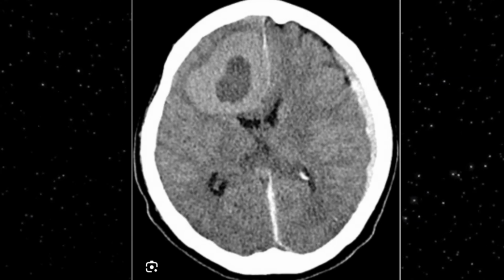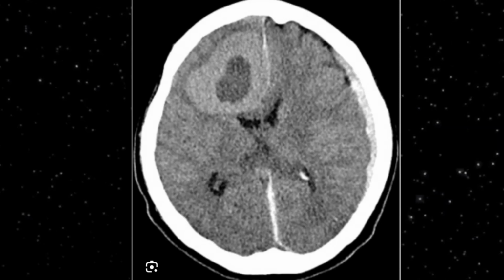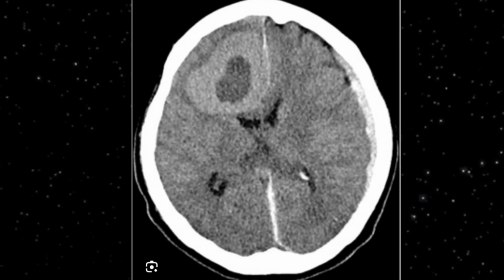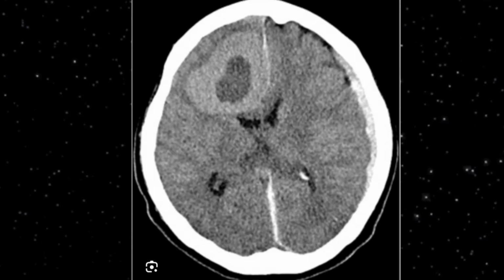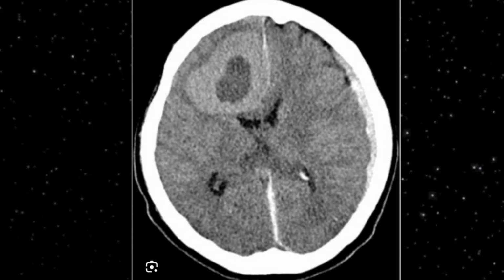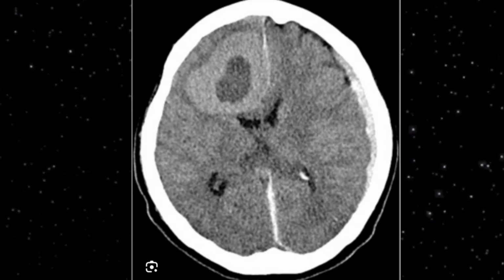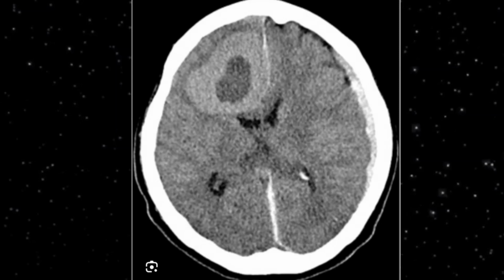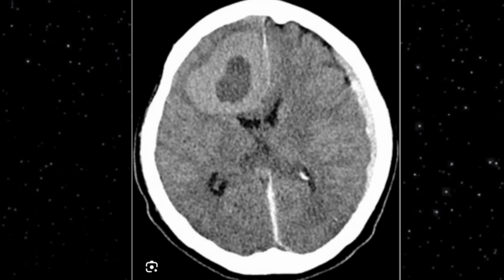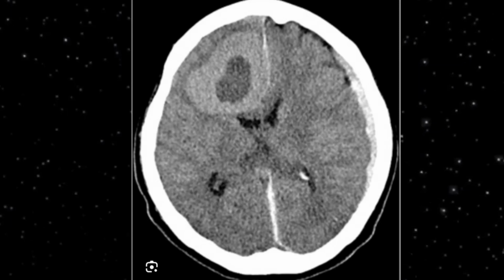As per WHO classification, grade 1 happens to be benign. That was in the first two slides I have shown you. And that is grade 2 WHO grading, which would be called atypical, with an increased mitotic activity because it is rapidly progressing. And the second thing is central necrosis is present there, so that would fall in category 2, or grade 2, of the WHO classification.